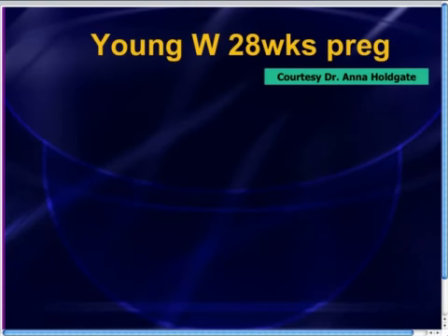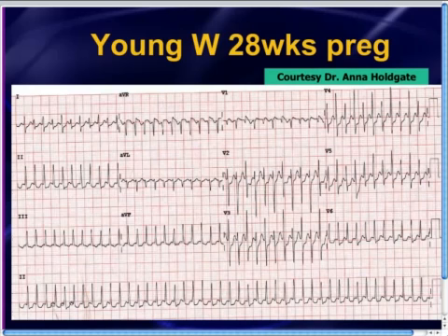This week's case was sent to us by Dr. Anna Holdgate, who is an emergency physician working down at the Liverpool Hospital in Sydney, Australia. So this week's case was sent all the way from down under. This was a 28-week pregnant young woman who presented to the emergency department with palpitations. And as you look at this EKG, there's no surprise why she is palpitating.